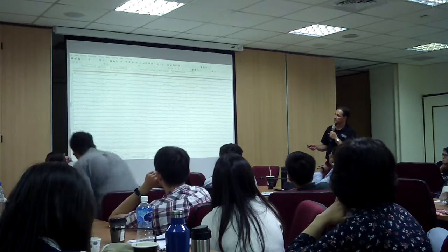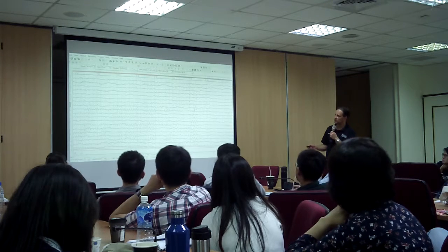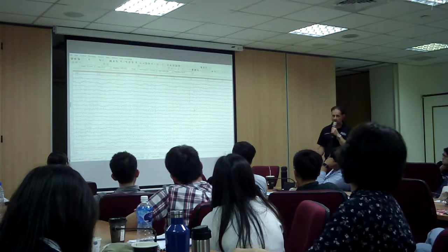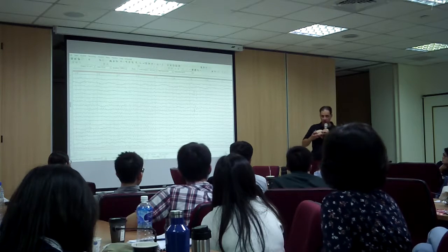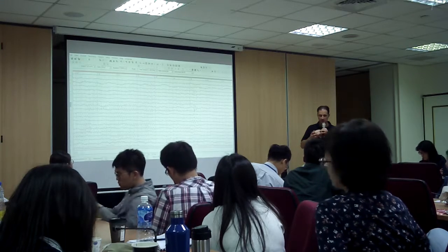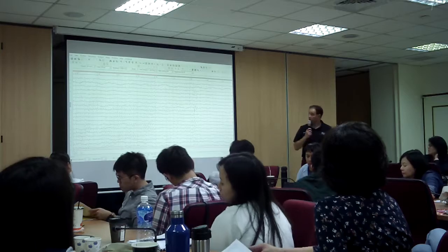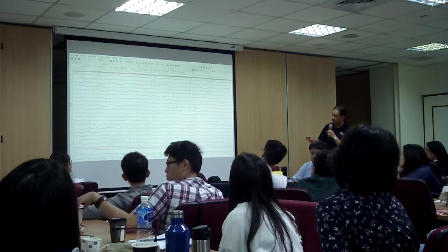Now, this, where was it again? So this one right here, and this one right here, and this one right here. Okay, and you saw the slowing at T3. So it's F7 and T3. So let's remember, F7 to T3. What area of the brain is that? That's your ABC 1, 2, 3 language production, which is what area? Broca's area.